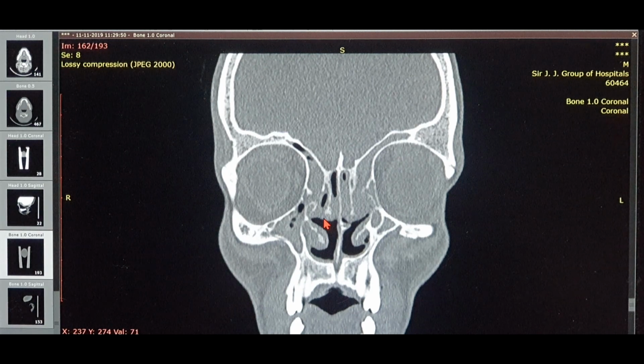Now, the next question that the examiner can ask is this: they are not going to ask any simple questions, remember that. They're going to ask only confusing questions. The first one was the NLD. The second one will be somewhere around the anterior ethmoidal artery, say. So the examiner will ask you, identify me the anterior ethmoidal artery. Now, you all just have to remember there are 3 points where you can identify the anterior ethmoidal artery.